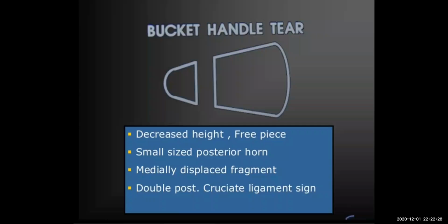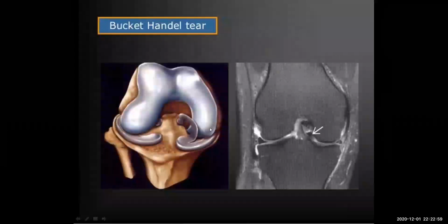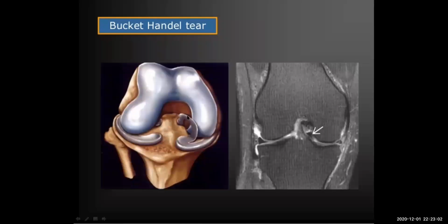handle tear. Again, if you go to the coronal, you can see the meniscus is not complete. You find part of it goes inside the notch. In the notch view, you always find a black spot attached to the condyle, which could be the PCL, and always underneath it you find another black spot, a double black or double hypointense structure. Most likely this is a bucket handle tear. Okay? This is what I told you before, that it detaches from the mother meniscus, then it goes anterior.